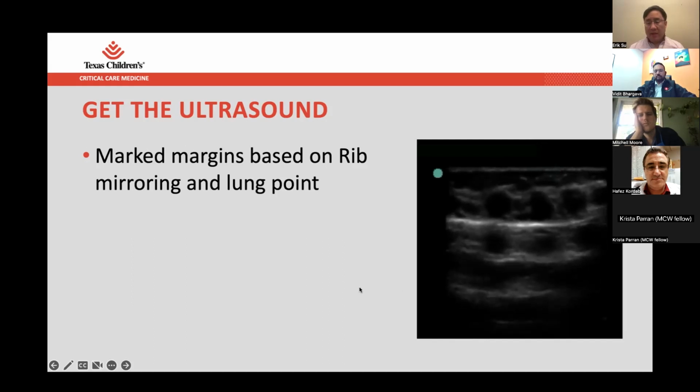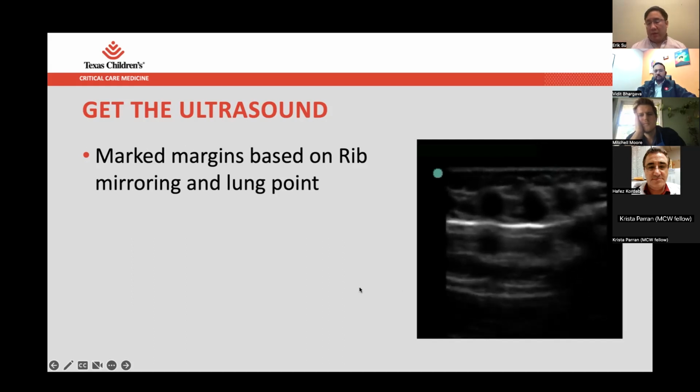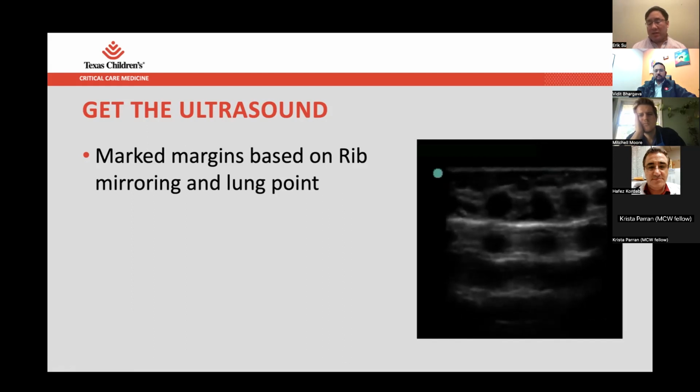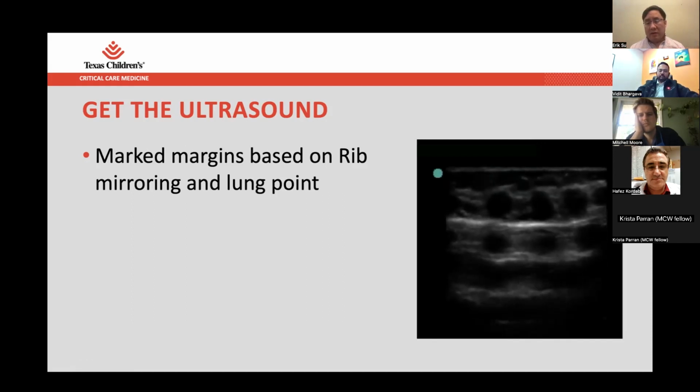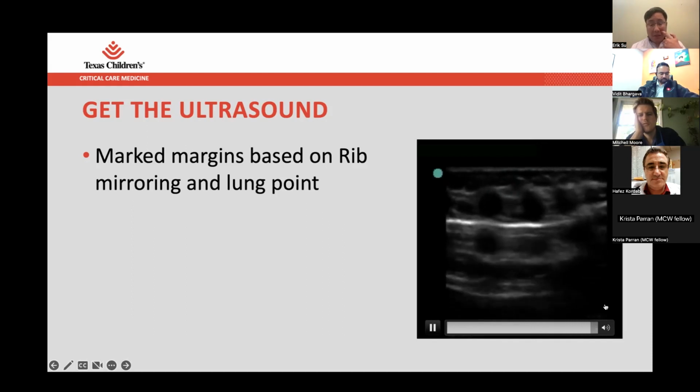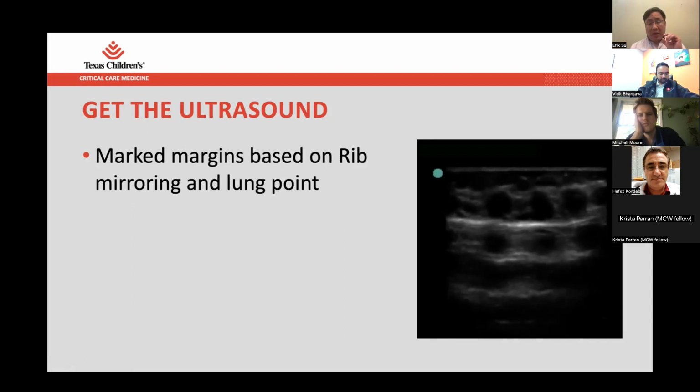But the idea is that the lung sliding was hard to see because this kid had so much lung injury in the past, and the pleura was already damaged and tethered in several areas. So when we saw this, we had to use it in conjunction with everything else, because right now the only other paper out there on this is a NICU paper that said they saw this in every kid that they had a pneumo in.